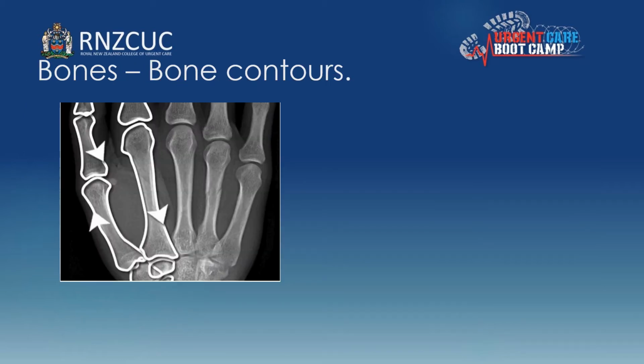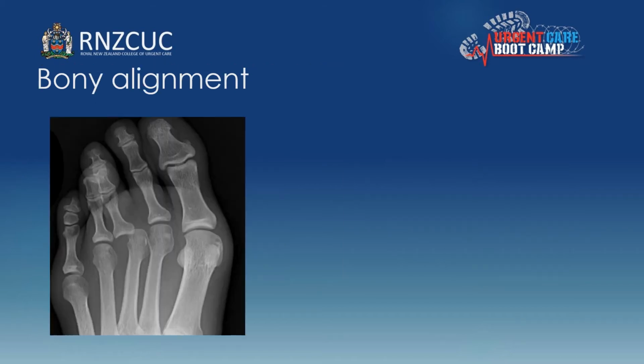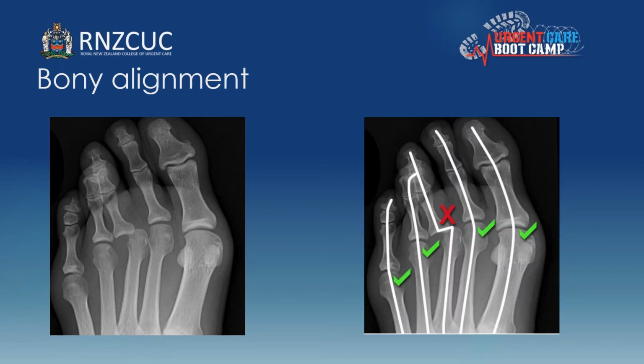So on to B, go around the bone contours, and whilst it seems laborious to start with, you soon get very quick at running your eyes around the edges of every bone. And on this example X-ray, if you follow every bone around, you can see an obvious crack in the ring finger metacarpal there. If you're looking at the alignment, making sure everything lines up, and again you can see that the third toe MTPJ is dislocated in this patient.